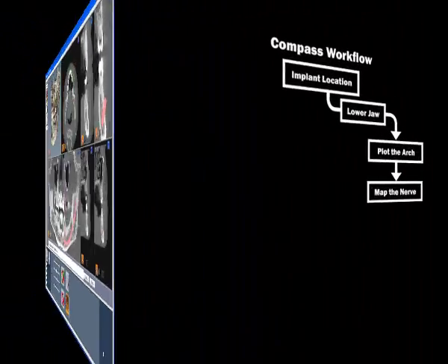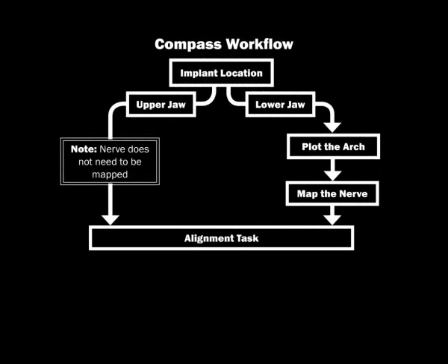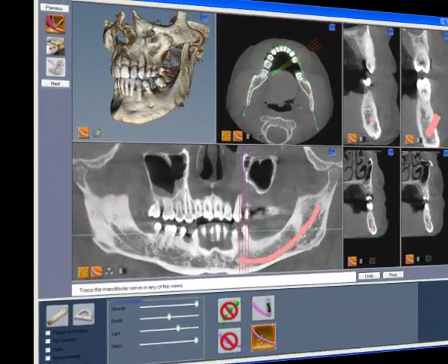Our next step is to align the scans. Use Alignment Task to designate the corresponding points on the CT data and the E4D scan data. This enables you to align the two models to ensure good virtual implant placement in relation to the proposed restoration. Left-click Alignment Task.